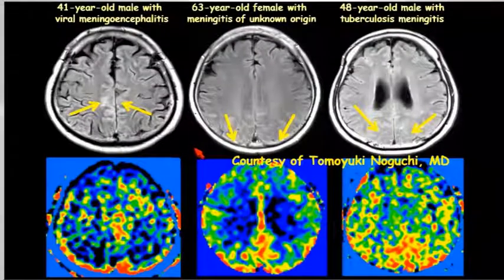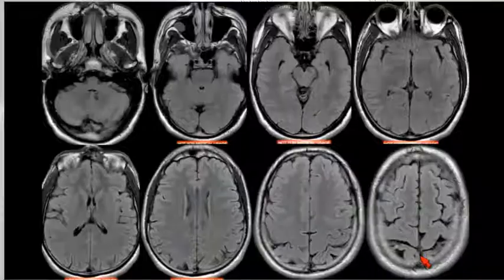Now, it shouldn't surprise you that perfusion can be abnormal in infection. Again, the leptomeninges are the site of the main pathology, and a lot of inflammatory mediators are surrounding arteries and veins, so you can have secondary ischemia. It follows then that in those areas you can have regional areas of oligemia. In fact, several years ago we did a little study of cases of meningitis and found that 75 or 80% have regional perfusion defects correlating to that leptomeningeal involvement.